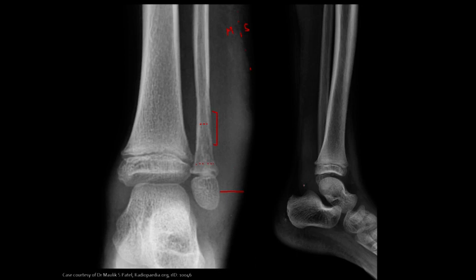Additionally, when we look in the posterior aspect of the ankle, we can see Kager's fat pad, so Kager's right in here, has become compressed by this swelling. And there's a little bit of swelling in that anterior aspect too. So this patient has mostly soft tissue swelling with a little bit of permeative osteolysis.